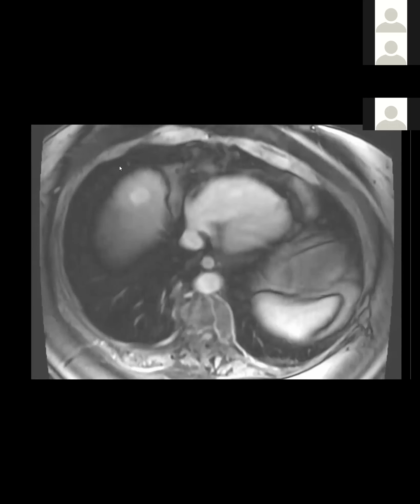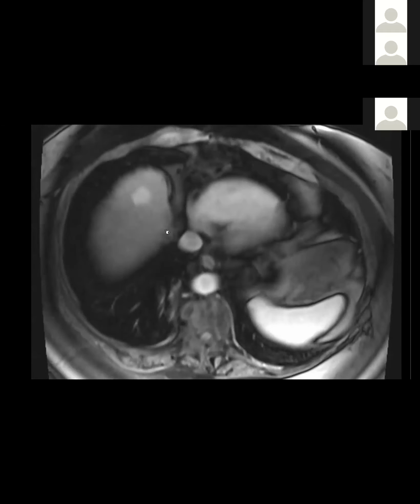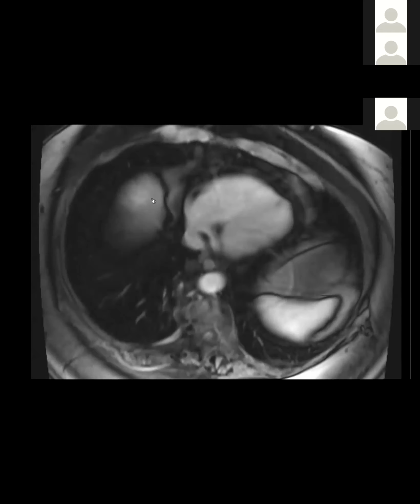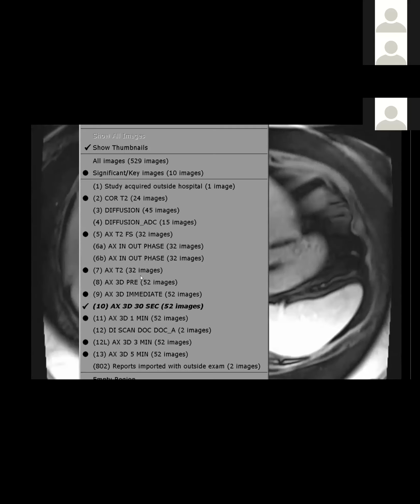So to me, this is almost... Does this patient have liver disease? A dysplastic nodule could look like this, no? This was not a liver disease patient. It's still small enough to be... I think that I would not. I'm going to be honest, I would not.